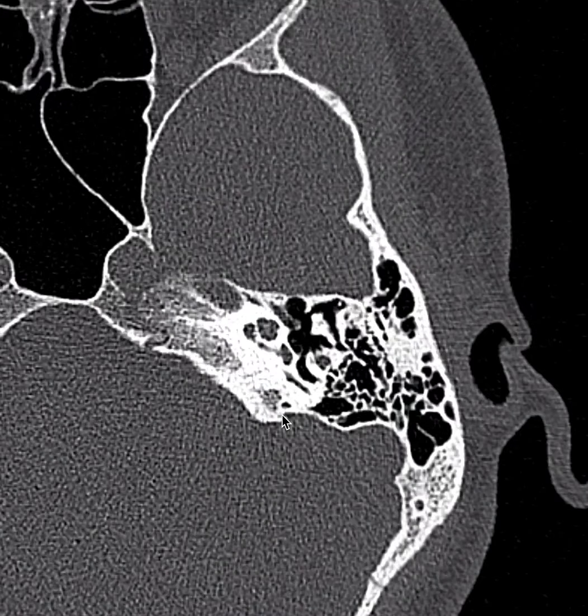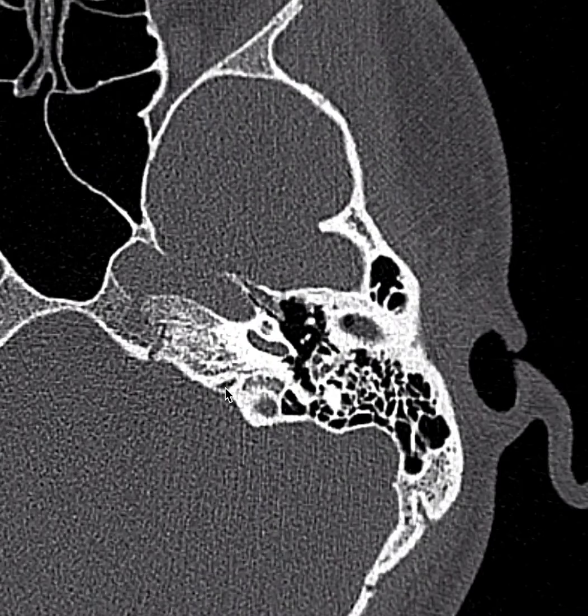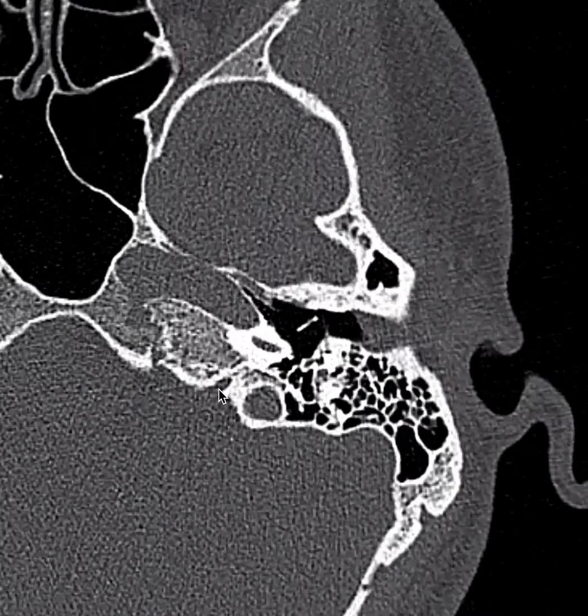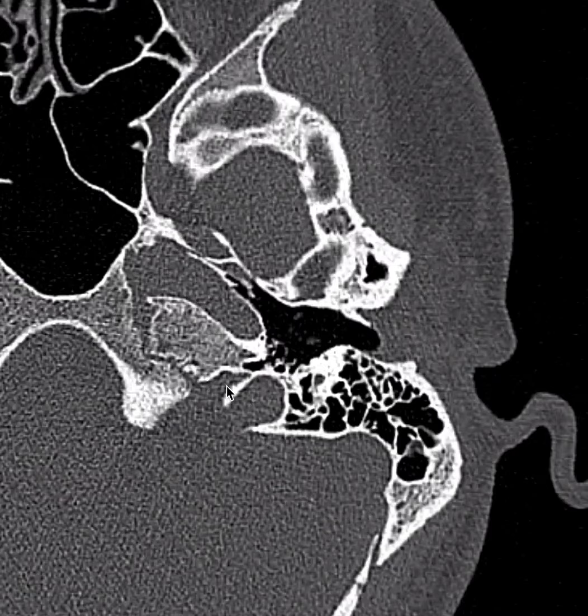Scrolling a little more inferiorly now, I'll draw your attention to another opening seen right here. This is called the cochlear aqueduct. The cochlear aqueduct carries perilymph from the scala tympani through the petrous portion of the temporal bone into the CSF of the posterior cranial fossa. So just lateral to it will be this jugular bulb, and if I go inferiorly, just inferior to it, we'll have the carotid canal.